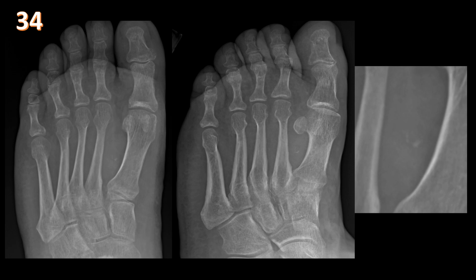So we have PA oblique views and cone down views of the area of interest in the right foot, and we see that there is intermetatarsal soft tissue, kind of linear calcification. It is not really a phlebolith because it doesn't have a lucent center. So we should have a soft tissue calcification in this patient that came with a palpable mass. So we order further evaluation with MRI.